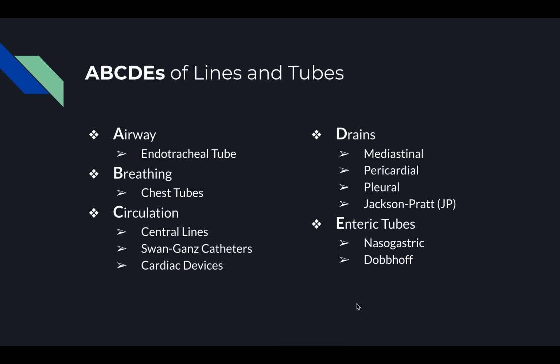And as one final word, there of course are many different ways to read chest x-rays, and there are many different ways to keep track of different lines and tubes. This is just one approach, and hopefully you found that helpful.